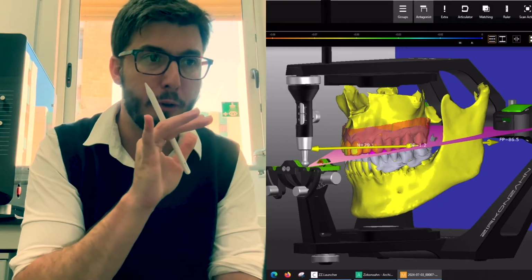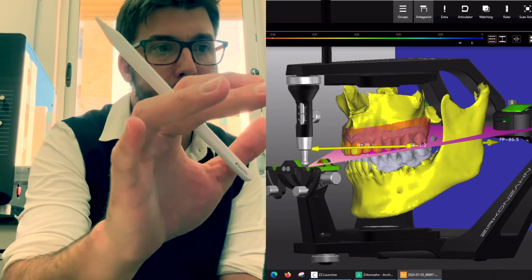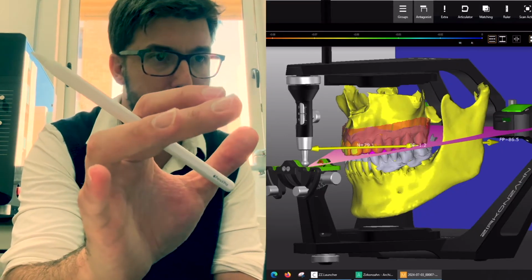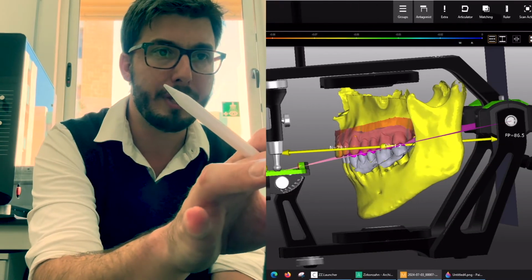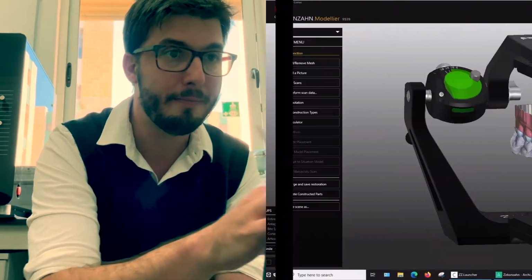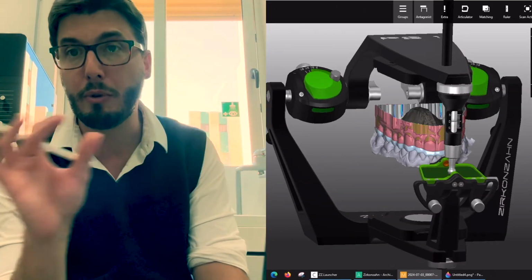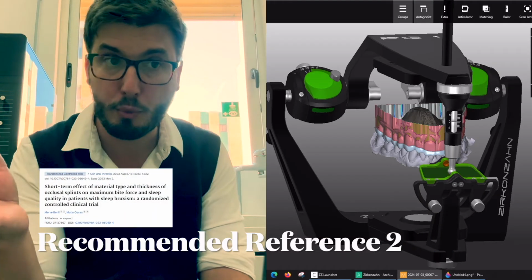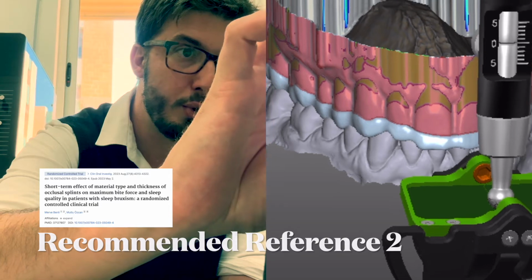So we have that automated occlusal plane, and we are using this plane actually to mount the virtual articulators in occlusion. All right, so that's just a lateral view of the same thing that I was telling you guys now. And now we have the virtual articulator only with the intraoral scans, exactly what you need to do here. And then we have this extrusion of the intraoral scan.